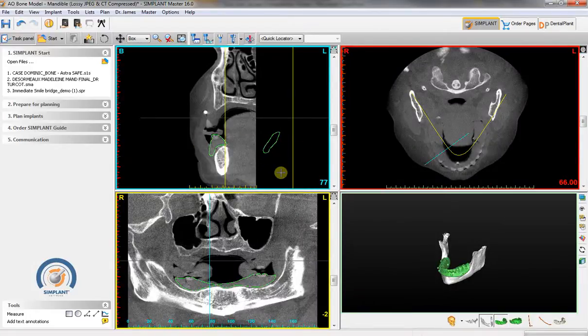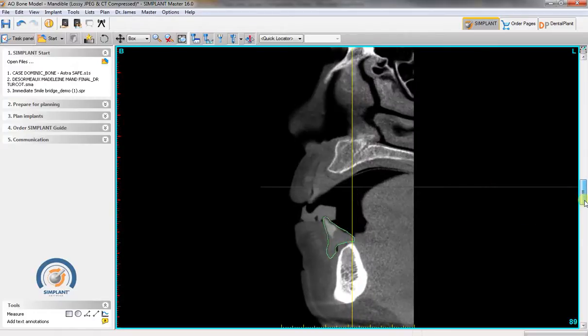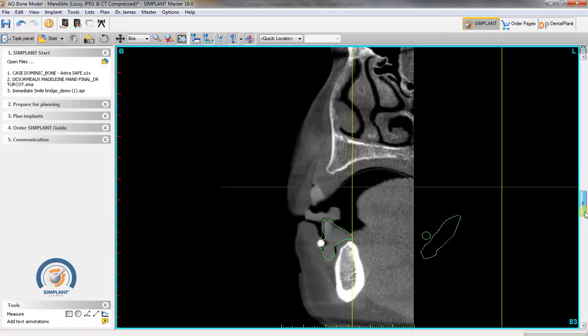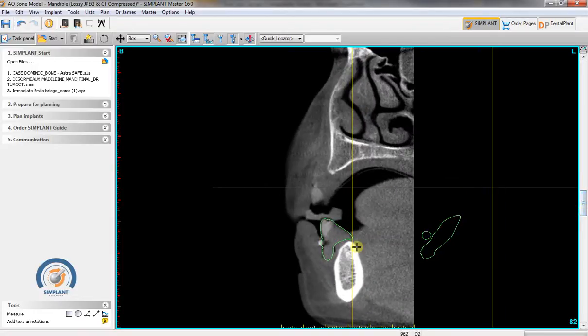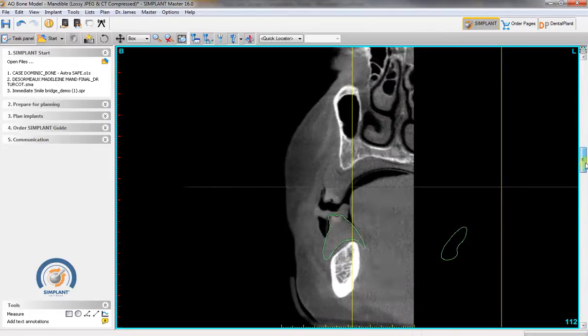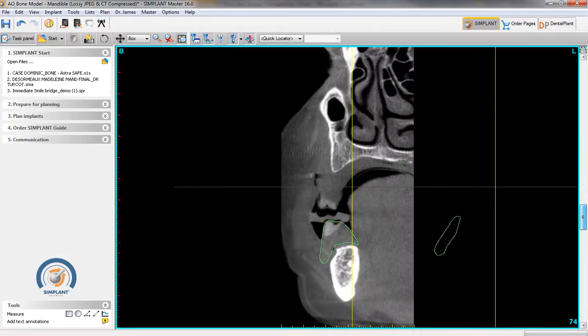So now if we take a look at the inside here on the cross section, we can clearly distinguish here that this is the prosthesis, this is the mucosa and the bone. So if we look around, you can see that it's actually very important that there is no air gap between the mucosa and the denture. We can sometimes see there's a little bit of black here, which means that it's not perfectly sitting, but that's okay, that's perfectly acceptable, seeing a little bit of air gaps right here. But over the entire mandible here, we can actually see that it is a well-fitted denture.